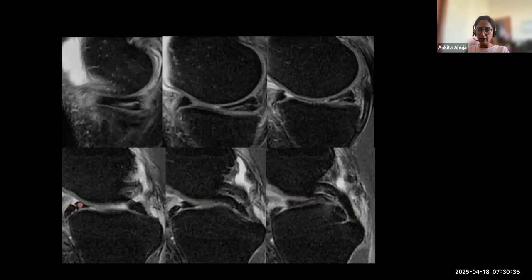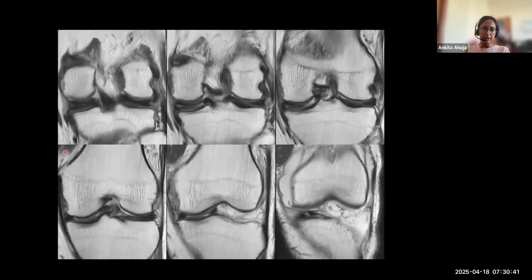And these two anterior horns because of the bucket are called the double delta sign. So let's see here, the body looks pretty small, right? And you see some extra thing lying in the intercondylar region. So this is your bucket handle tear. So whenever you find something small, look for flaps or look for a bucket.